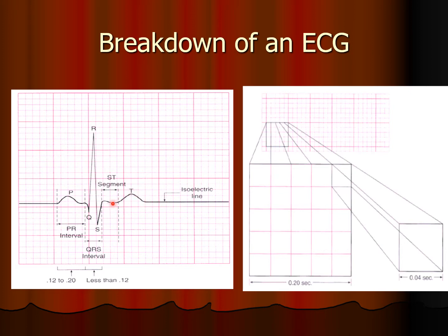Okay, well, that's going on over here too. The ventricles do so much. They keep us alive our entire lives. And this is the one little, less than a second, that these ventricles have time off. They're taking a nap. Do not bother the ventricles during this rest period. Okay, now the atria have a rest period too, but it gets hidden in this big wave over here. You don't see it, but we get to see the nice rest period for our ventricles in our T wave.